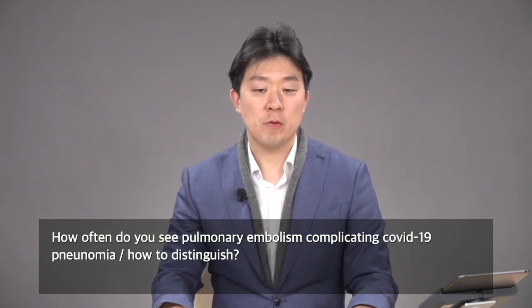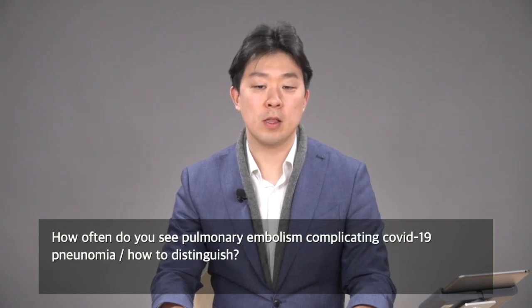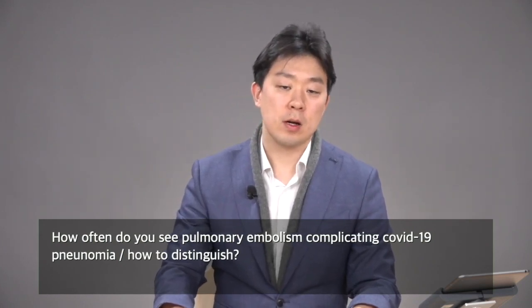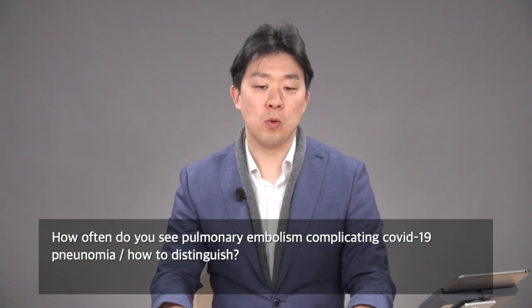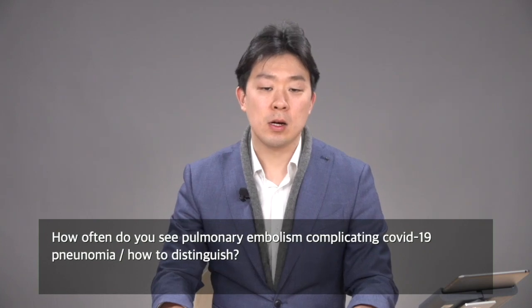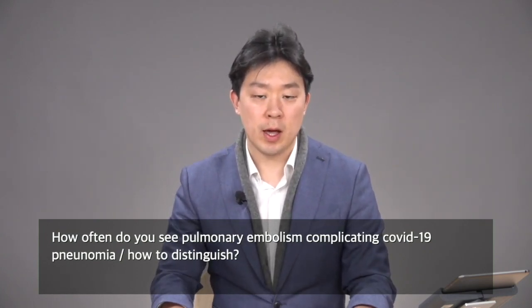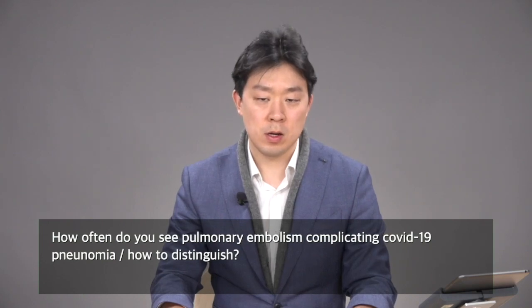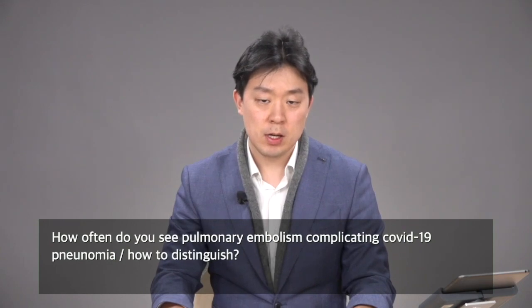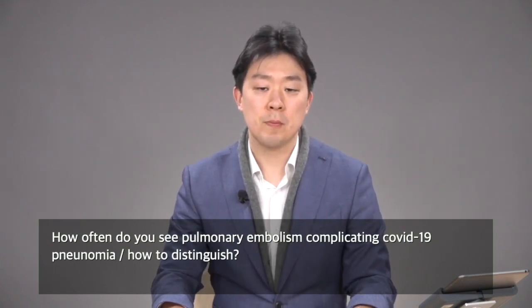Actually, I have never encountered a patient with COVID-19 who had pulmonary embolism. For the immediate workup in COVID-19, non-contrast chest CT scan is generally recommended, as contrast enhancement in the lung parenchyma may mask the presence of a subtle GGO in COVID-19.